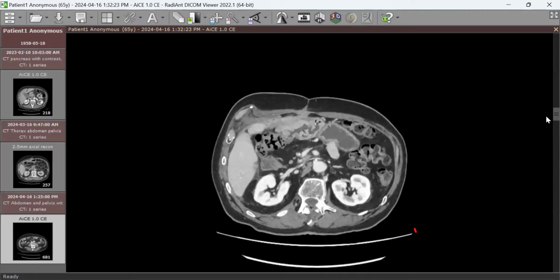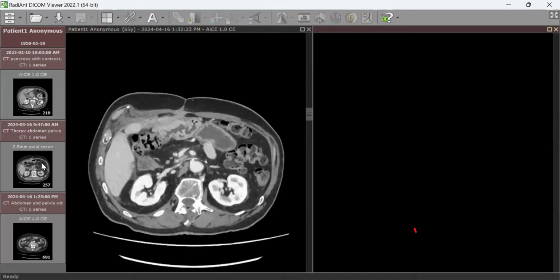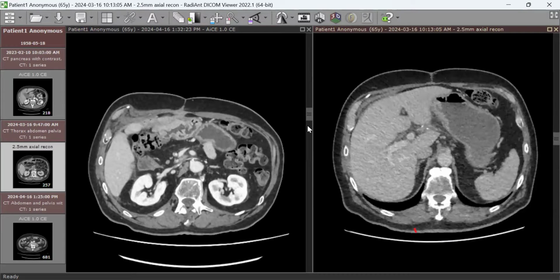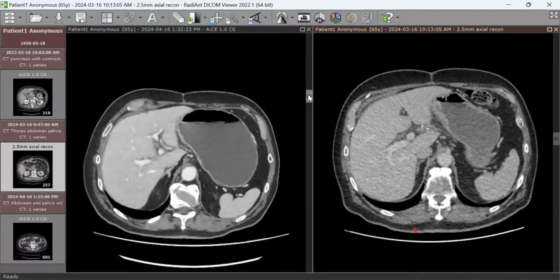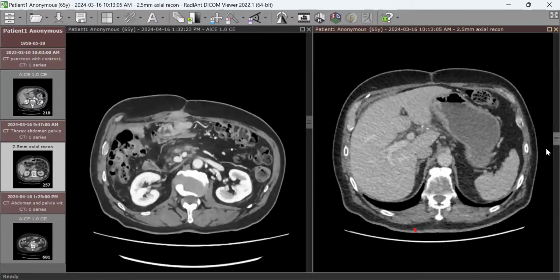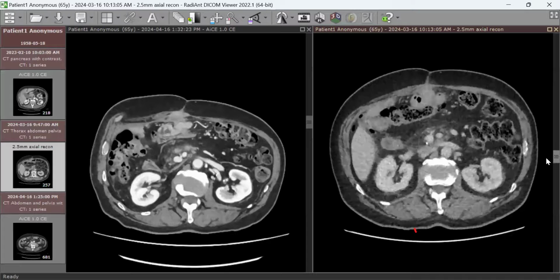I'll show you the previous. I think this over distension of the stomach, gastric outlet obstruction. Yes, look at this one. This one done before. And this one, put it on here. Yeah, obviously there is gastric outlet obstruction. And that's why the patient, the cause of vomiting is gastric outlet obstruction. Yes. Okay. Now look at the previous one and tell me what's the reason. What caused that?